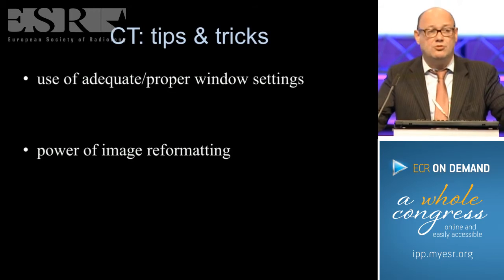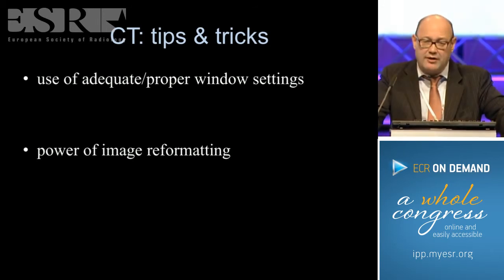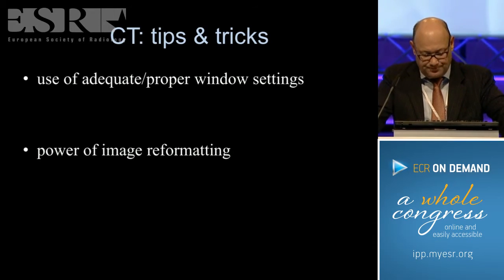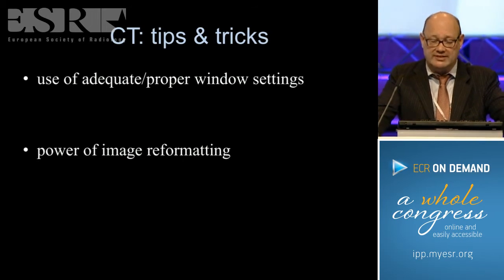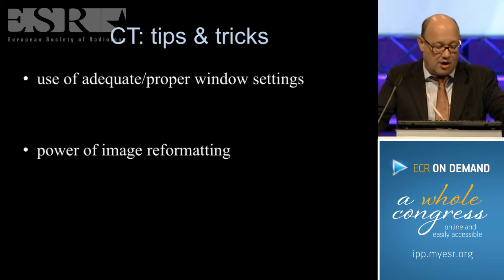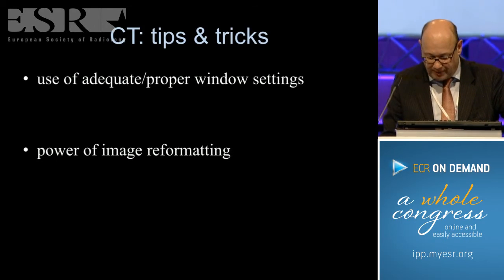I discussed with you about the possibilities of CT, and I made a comparison with MR. Of course, there are some tips and tricks that we can use. Sometimes you should use proper window settings and not rely on the standard window settings that are brought to you by the vendors. And also, I cannot stress this enough, that it is important to make reformattings or reconstructions in the sagittal or coronal plane.